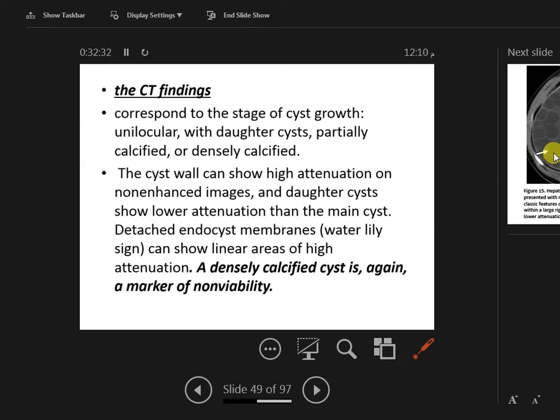While the matrix is a little bit dense first. Second, the person asked about enhancement. Since the cyst is not from the body, it does not take nutrition from the body, no blood supply from the body, the cyst itself, the endocyst, is not enhanced. While the pericyst, the fibrous layer, is from the body, and it's active. So you might expect some enhancement.